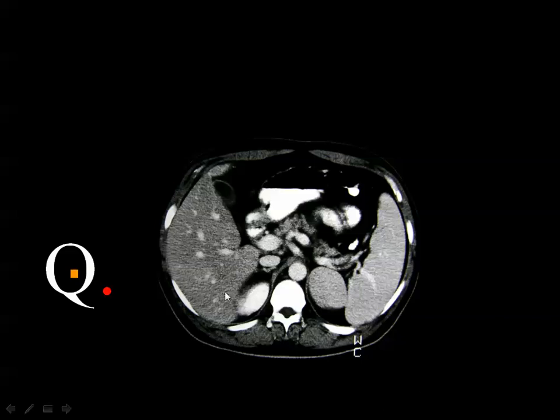And fatty liver. Yes. This is a post-contrast CT scan of the abdomen, oral and intravenous. The liver is fatty because it looks hypodense compared to the splenic parenchyma, and there is a spleniole. The spleniole is the son of the spleen. Let us say that, and it should look exactly similar to the splenic parenchyma in all imaging modalities: in ultrasound, in CT, and in MRI.